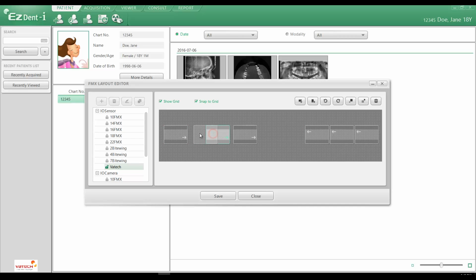We can then move these around to lay it out aesthetically, and then from there, if we wish to, we can add 2 vertical ones. Left click and drag it into place, left click on the second one, drag it into place as well, and then again we assign it and lay it out so it's symmetrical from an aesthetic point of view.